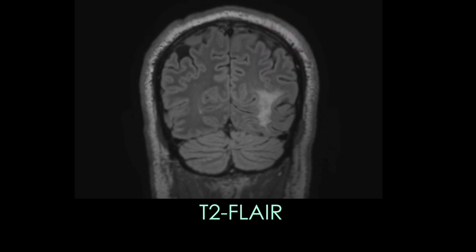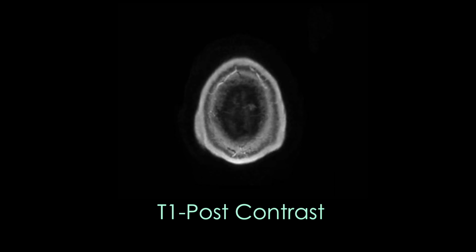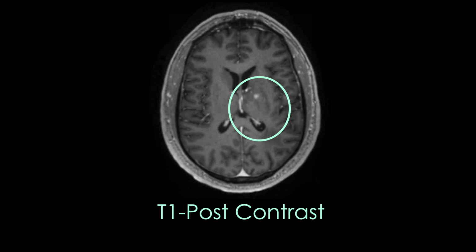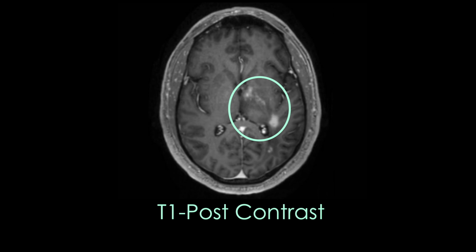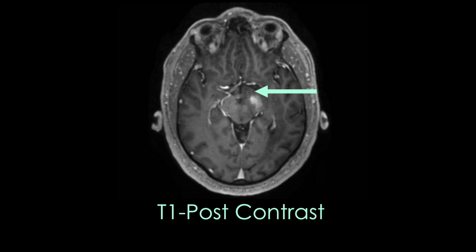So a good next question is, is any of this enhancing? Take a look at our T1-weighted post-contrast sequence. We can see that we have somewhat patchy, discontinuous enhancement within the previously described regions, including the left optic tract fibers here.